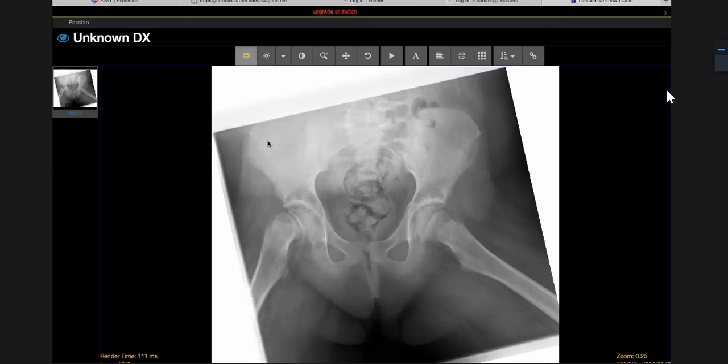What do you expect demographically this patient to look like, age, and that kind of thing? Peri-teenage, a bit of an overweight teenager. Usually it's boys, though this is a girl, and they might come with a limp. That's usually the presenting complaint. So this is SUFE, a nice case of SUFE.